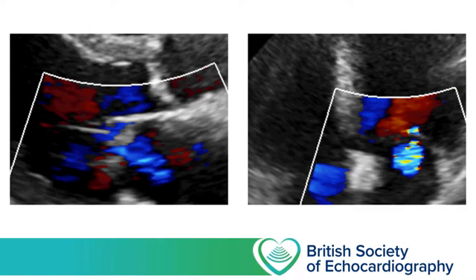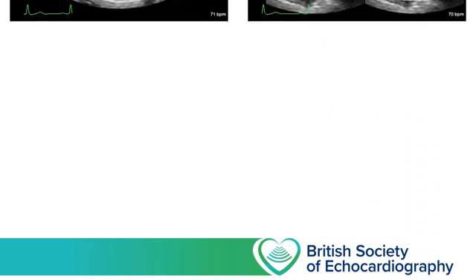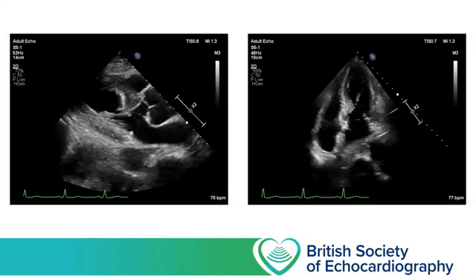And if we look at the images with colour flow and slow them down, and then pause during ventricular systole, we can see a small amount of mitral regurgitation. And if I were formally reporting this echo, I'd consider this to be trivial, and for the purposes of a level 1 scan, I'd consider this to be insignificant. Here we have another example of trivial or insignificant mitral regurg.